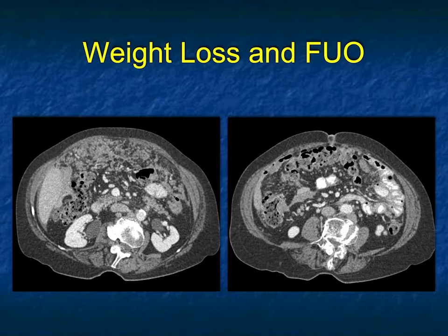There are a number of tumors that commonly give omental caking. Now, the patient has fever, but patients with malignancies often do have fever. I was once shown a case like this in conference, and they told me the patient was from Ethiopia. That didn't quite help me. Maybe it should have. The one thing that can look like carcinomatosis with omental caking is tuberculosis.